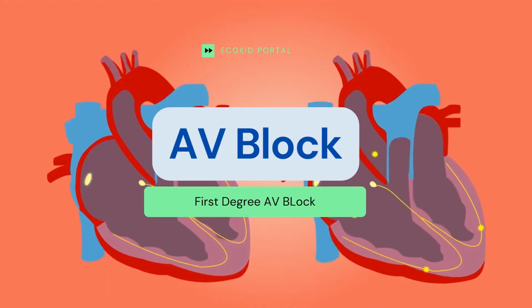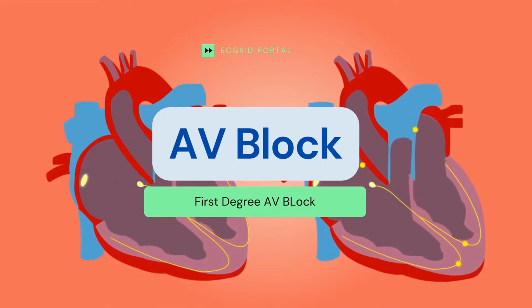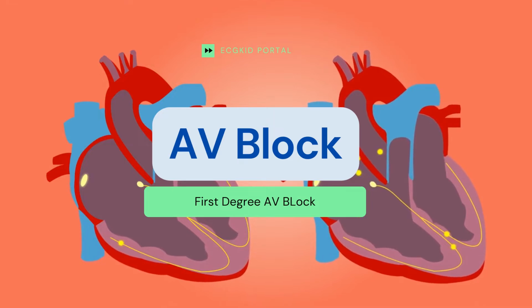First of all, we will explain each AV block along with a live simulator and its mechanism and some of the ECG features. So, let's get started.